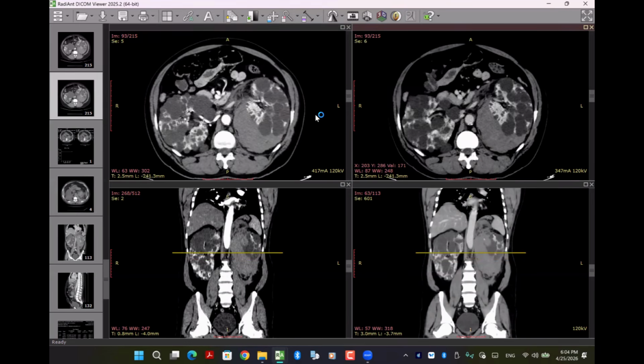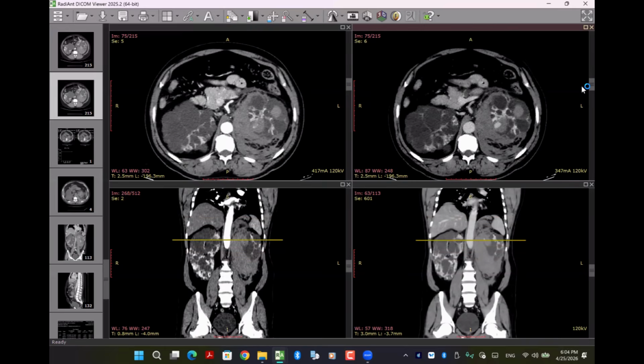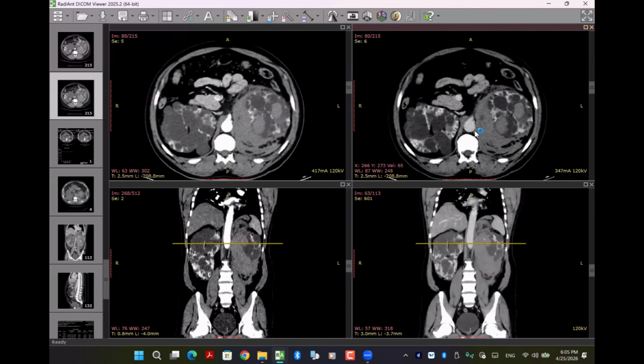But what happened with this case? Give me a clear diagnosis of this case. So it is active arterial extravasation in a case of autosomal dominant polycystic kidney disease with perinephric hematoma and extension of the hematoma into the bladder. Exactly, because this patient was hypotensive at this time. So immediately they shifted him to the interventional radiologist to embolize this bleeder. You got my point?